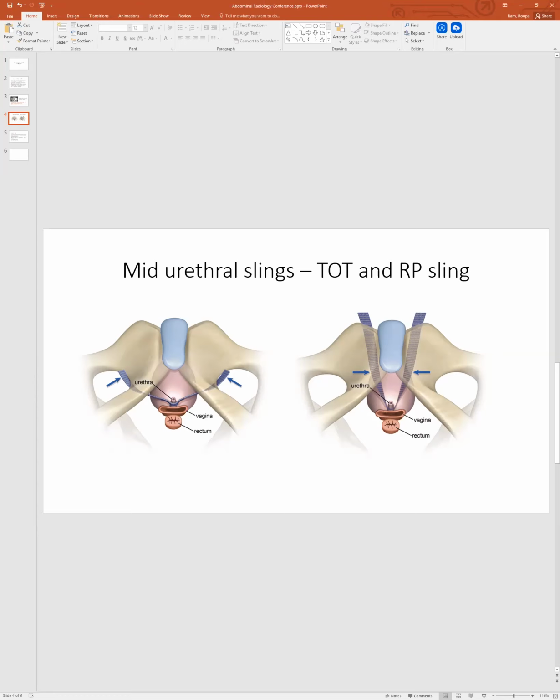The sling itself was placed years ago and the patient returned with this draining tract in the medial aspect of the thigh. These things form blind-ending passages which are prone to getting infected even years later after the sling has been placed. So looking into surgical history is important. And once you know the configuration of these tracts, it's very easy to figure it out.